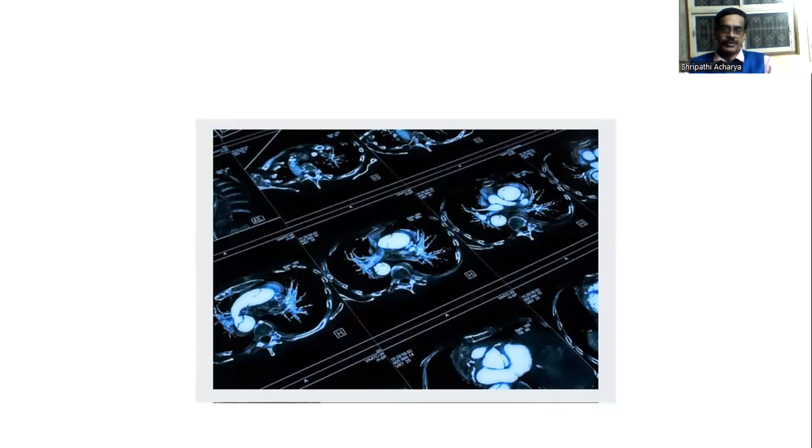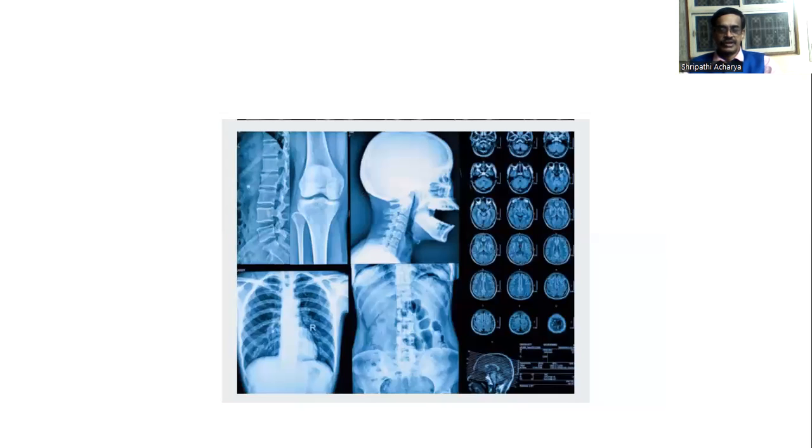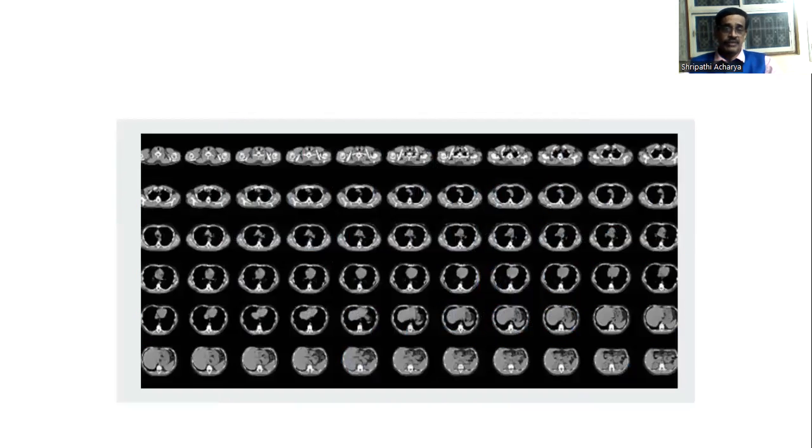In the computer screen, you can see at different levels the tomography. This is a tomography film where you can see the body parts at different levels. So the structures such as lungs, heart, blood vessels, and thoracic wall are seen. The muscles you can see in this X-ray also and CT also. This is a film with the tomography at different levels, starting near the neck and below the neck, chest, abdomen. You can see the structures.